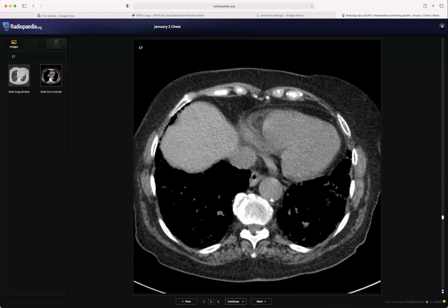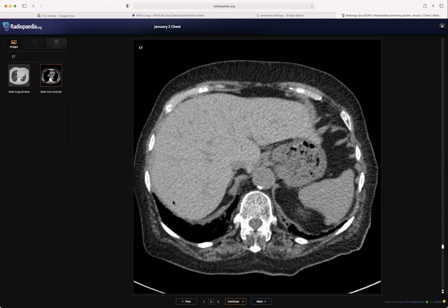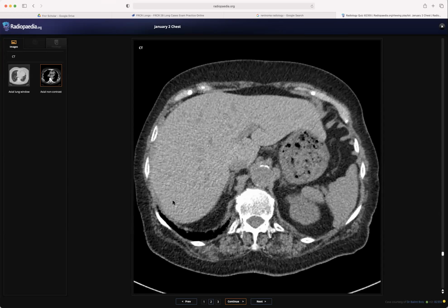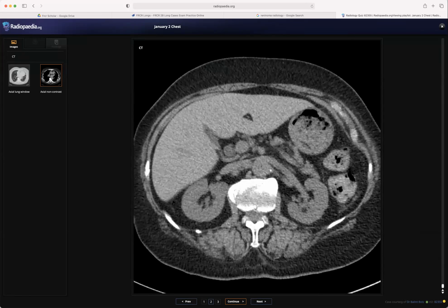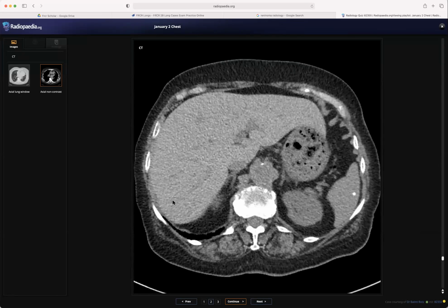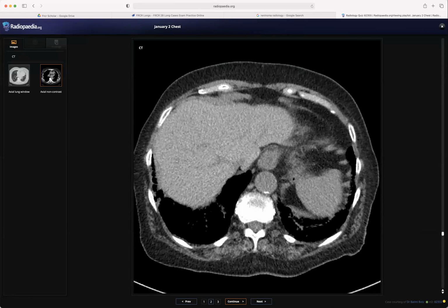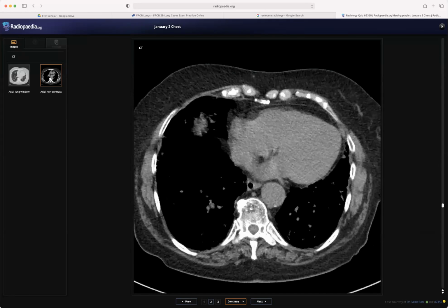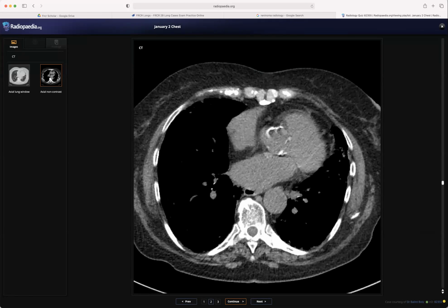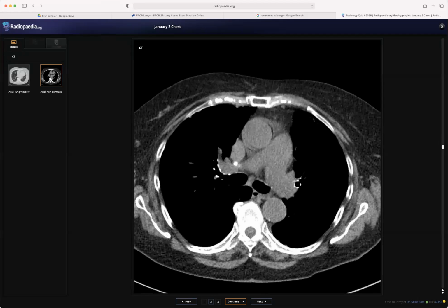So I would like to measure the density, also to see if there is any mineral deposition or if there is any drug intake. He is a cardiac patient. So amiodarone and other drugs intake also should be considered as a possibility here, because there is interstitial lung disease of UIP pattern together with hyperdense liver. Okay, so next case.